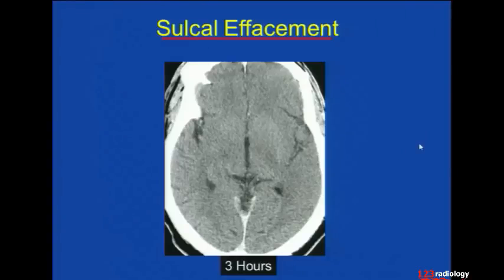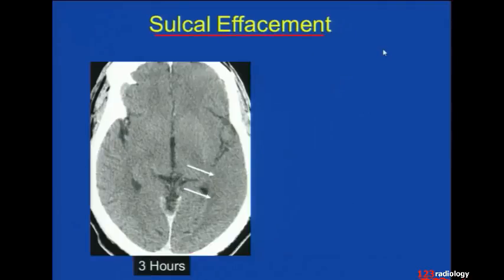Now, I'm showing you an example here at 3 hours, but in my experience, it's very unusual to see this finding within the first 6 to 12 hours. And I've reviewed the literature extensively on this, and most authors have indicated that sulcal effacement was rarely seen, only in about 10% of cases, before 12 hours. So this is an unusual case.